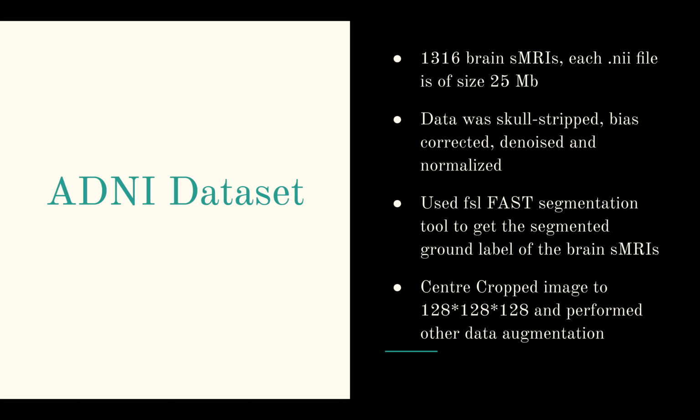The dataset was procured from ADNI. ADNI stands for Alzheimer's Disease Neuroimaging Initiative, which has the brain sMRIs of patients who are normal, who have Alzheimer's, and who have MCI. MCI stands for mild cognitive impairment. There were 1,316 brain sMRIs, each belonging to different subjects.